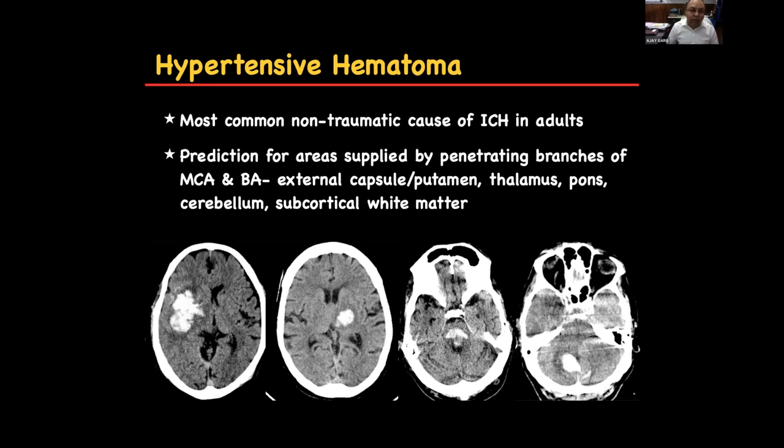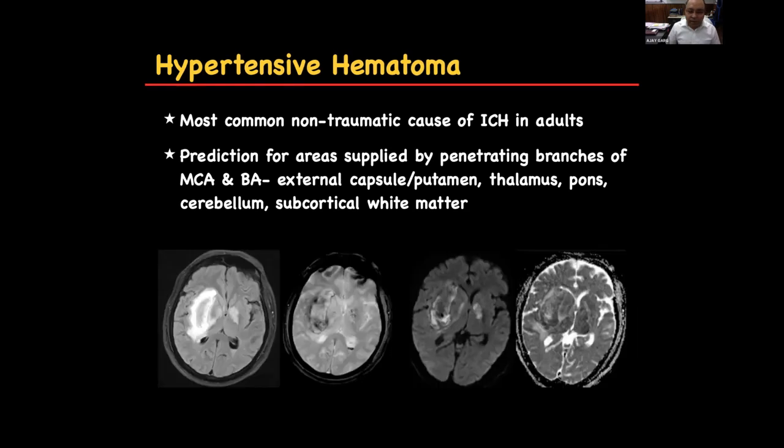On MRI, the acute hematoma may be difficult to differentiate. This may appear as areas of bright signal intensity on diffusion weighted images, dark on ADC. But if you look at your GRE sequences, you will see a thin hypointense rim that will suggest the diagnosis of hematoma. Plus, you can see the fluid level within the occipital horn or the body of the lateral ventricle, suggestive of hemorrhage.